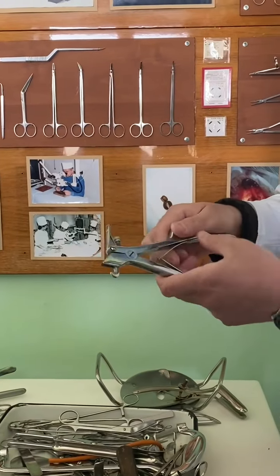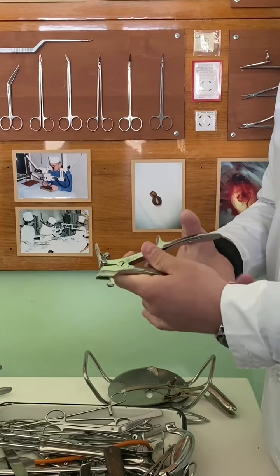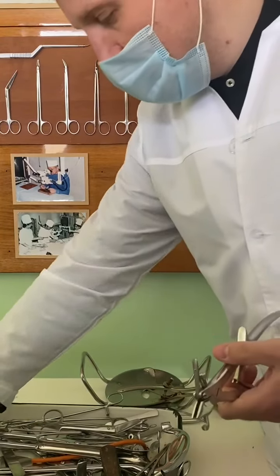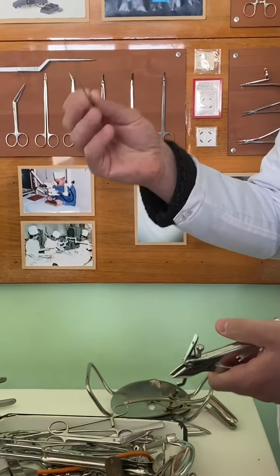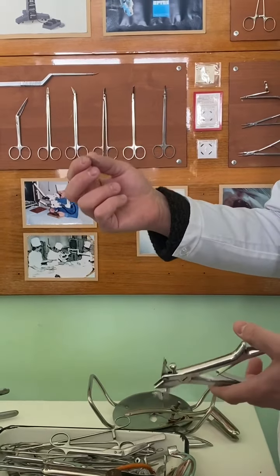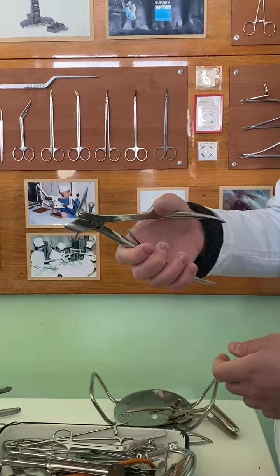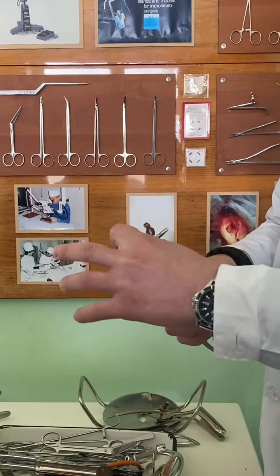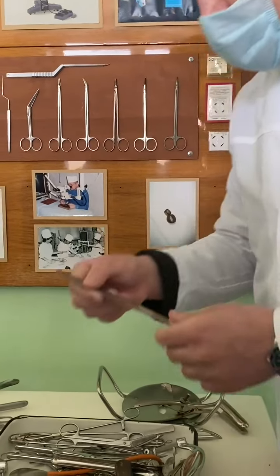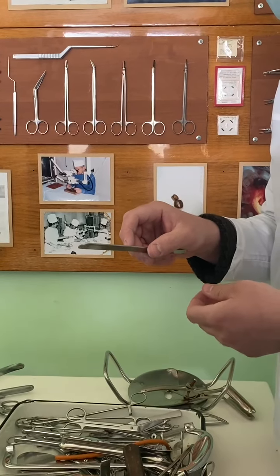This one, Dahlgren bone cutting forceps. It's for section of the skull when we need to do osteoplastic trepanation and do not have a Gigli saw. The Gigli saw is better. It's the primary instrument for section of the skull for osteoplastic trepanation. If it's damaged or not present, we can use Dahlgren bone cutting forceps, but here traumatization is bigger because of the wider workplace. Neurosurgical spatula to press down the dura mater during neurosurgical operations.